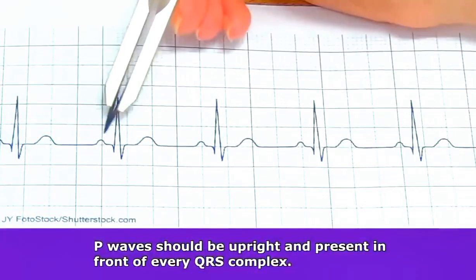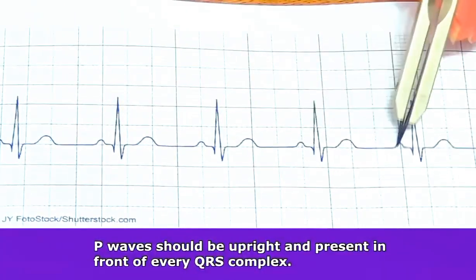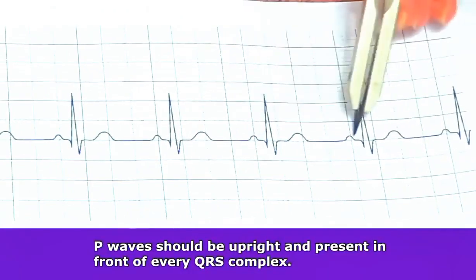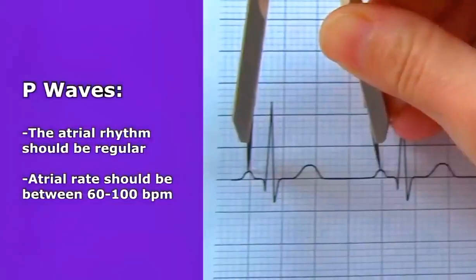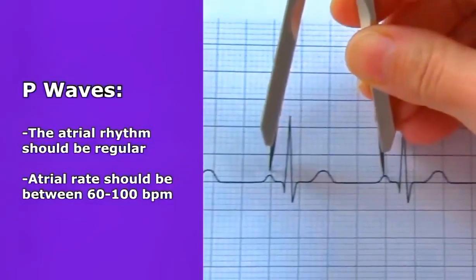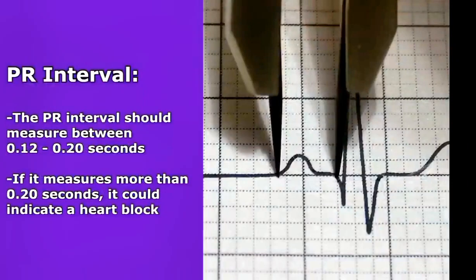Now, how do we know that we have normal sinus rhythm? Well, let's look at these characteristics and criteria that tell us we're dealing with normal sinus rhythm. When you look at the ECG waveform, you should note the P waves, and there will be P waves present in front of every QRS complex, and they should be upright and measure less than 0.12 seconds. This tells us about the atrial rhythm and rate. The atrial rhythm for normal sinus rhythm should be regular, and the rate should be anywhere between 60 to 100 beats per minute.